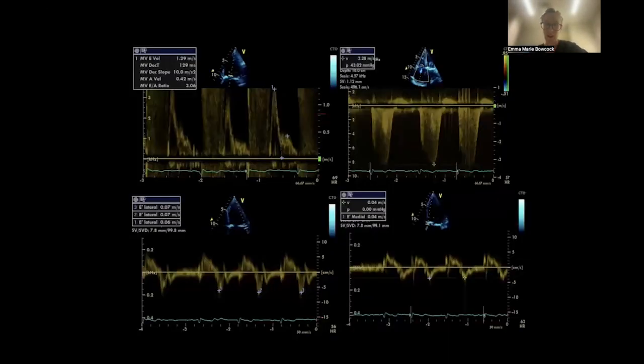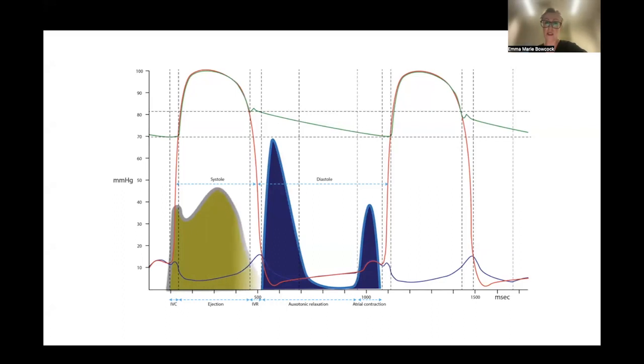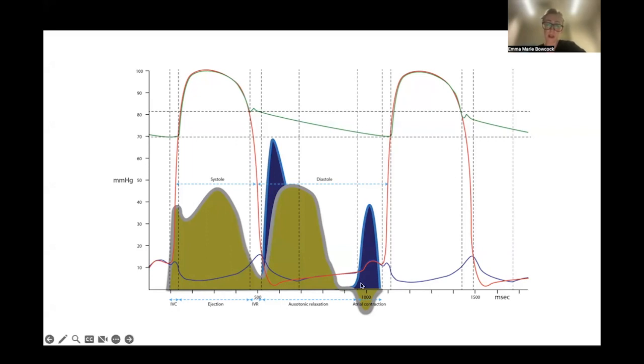And that's just showing the pulmonary vein filling, actually. I should mention that these slides are from the late Andrew Hilton, who gave incredible lectures on diastology, and he made all of these animations, and they're really wonderful. So I hope you find them useful.